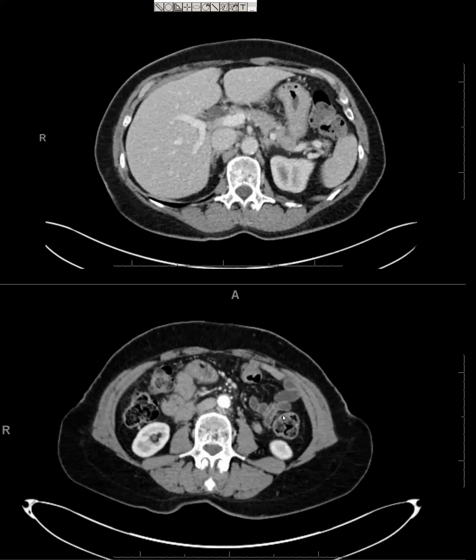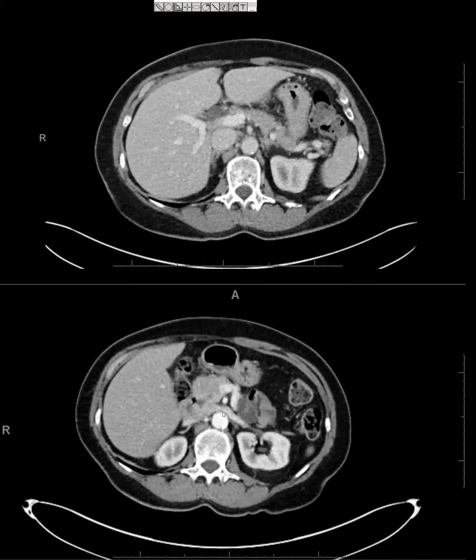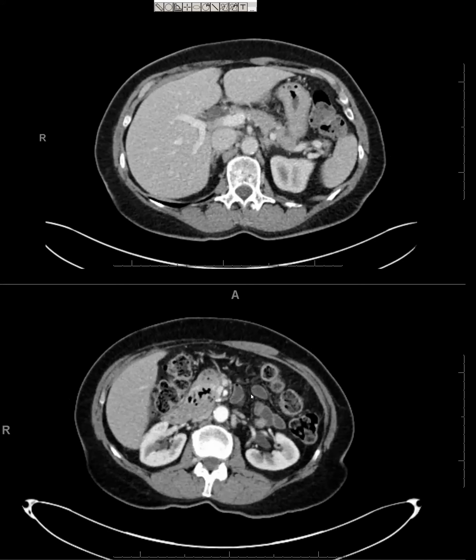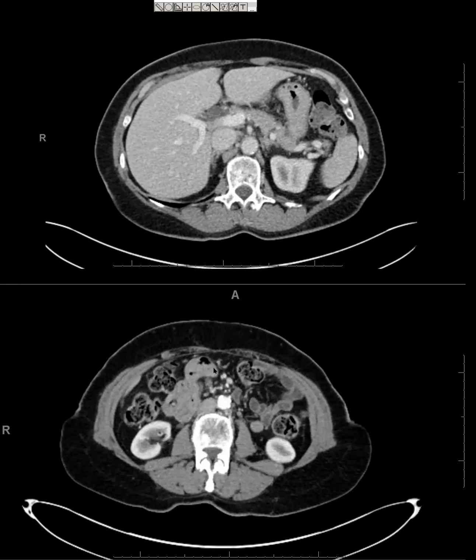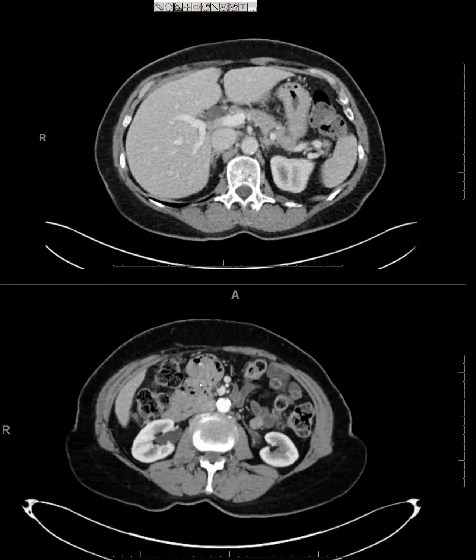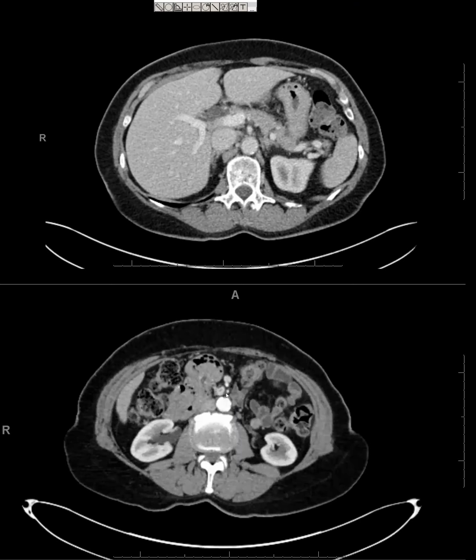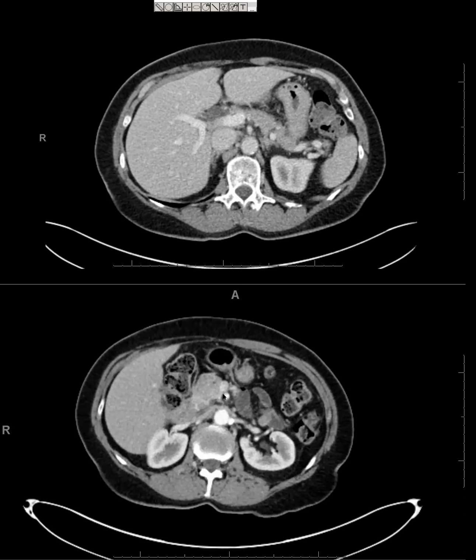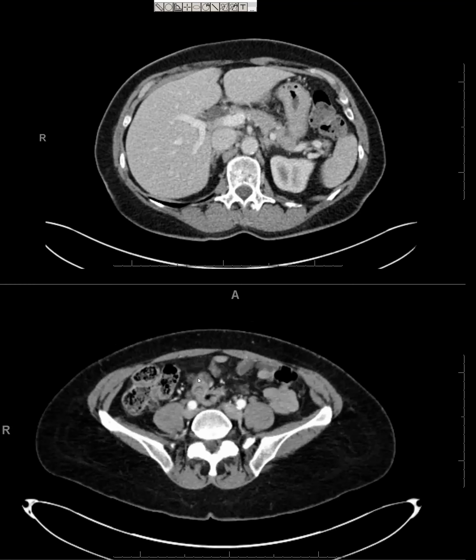And so we looked at that, and if you follow the upper GI here, you can follow the duodenum to here, and then you can't really see a transverse duodenal segment. This is the mesenteric root, and you're looking for a bowel loop going across here, and instead they cluster up here in the right upper quadrant and go down. There's also a mesenteric vein that normally goes around the back towards the ligament of Treitz, and that one is going down and away to the right. So then it does cross back over, but it's much lower here.